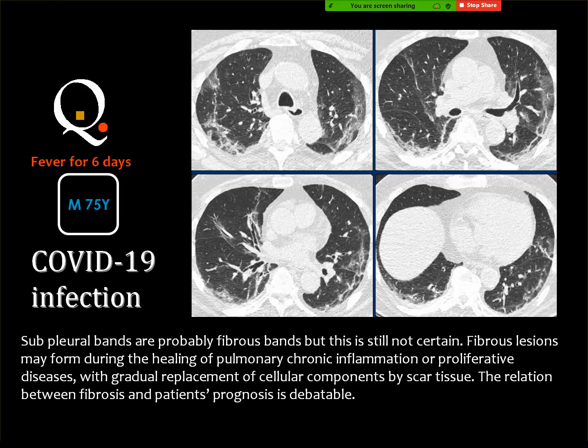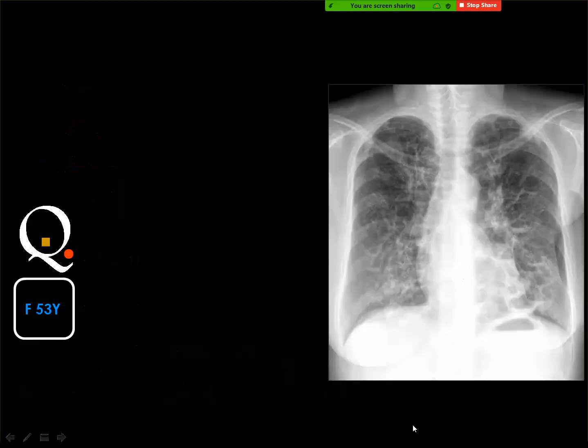COVID-19. Yes, very good. This is COVID-19 infection and is showing the most classic appearances with the ground glass and the subpleural lines, and this is the classic appearance of COVID-19.